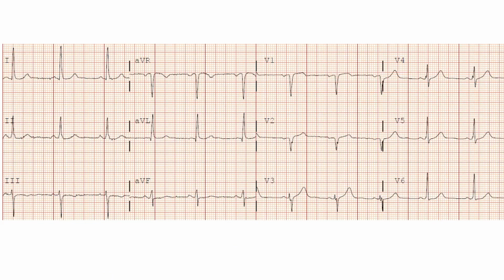This is another EKG. I hope you can all see it. It's another application. You have, again, LVH voltage criteria. You do fulfill Cornell here. This is a woman, and you are over 20 millimeters. R in aVL plus S in V3 is over 4 boxes.